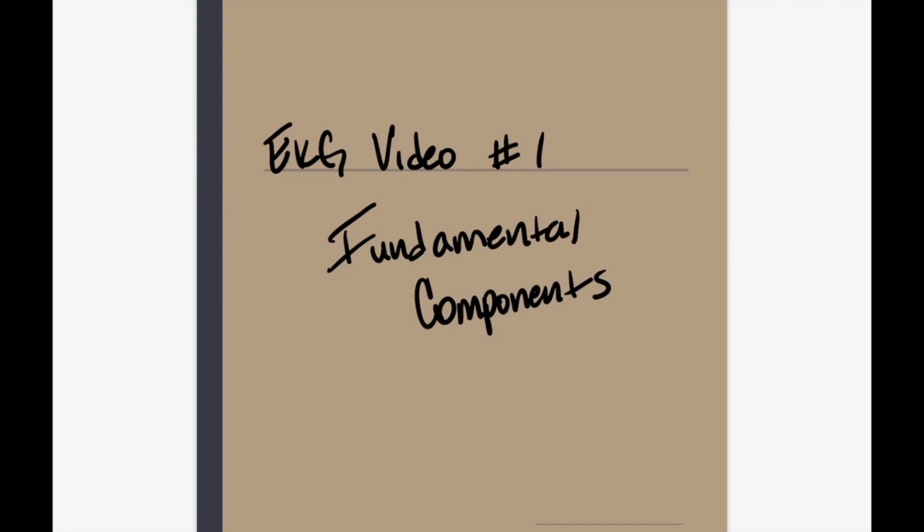Hey guys, and welcome. This is the first video in the EKG series. This video is designed to cover fundamental concepts of EKG interpretation.